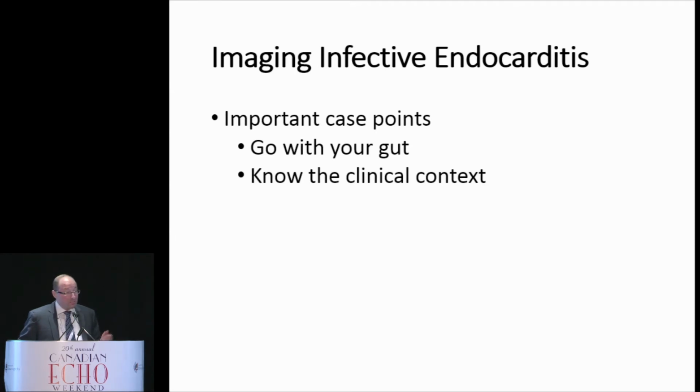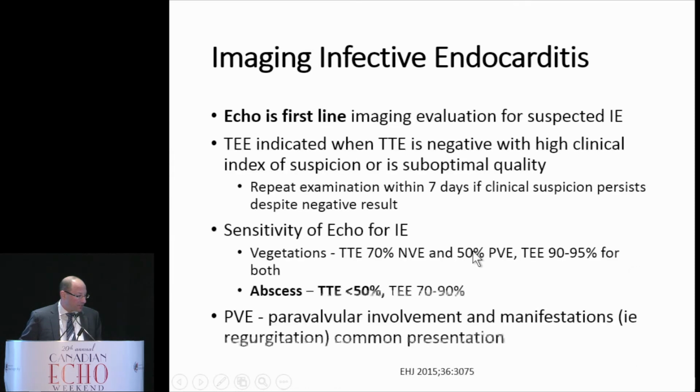Most of these patients are admitted to hospital, and so that information is readily available, and we really need to know what it is in order to guide subsequent investigations of this patient. I think one of the challenges with this echo report was not so much that that abscess was missed, which was very easy to do, but that a TEE wasn't recommended based on the challenging pictures and the case and the clinical context of this patient. So those were a couple take-home messages from this case.